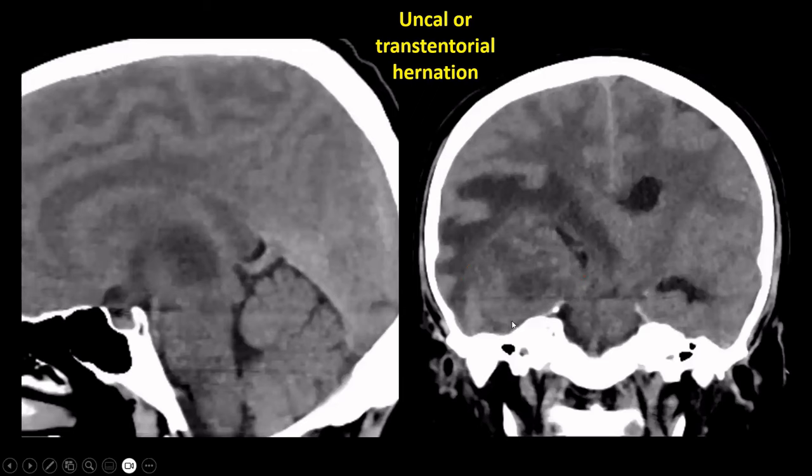If we look at the sagittal plane, or let's look in the coronal plane, we can clearly see the tumor located over here. This is edema, and we see here the tentorium. I'm going to remove these. Can you see it? These very faint, dense lines.